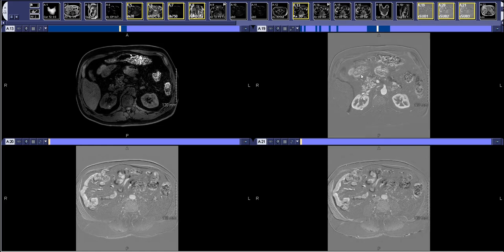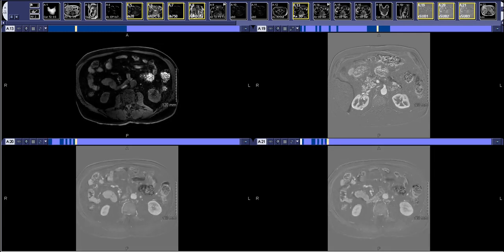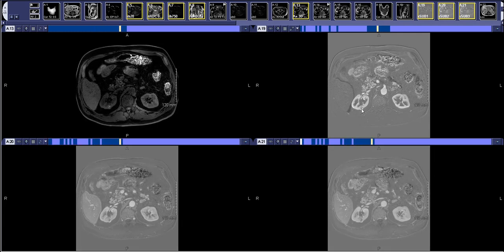In this case, there's little to no motion, and you can clearly see in the subtractions that this lesion enhances on all phases: arterial, venous, and delayed. And in this aspect, renal mass MRIs are very easy, because if you have a solid enhancing lesion, you cannot exclude a renal cell carcinoma. This could also be a benign enhancing solid lesion, but we can't differentiate on imaging. So essentially this needs to be surgically removed or ablated or closely watched, depending on patient factors. So in this case, we'll say finding suspicious for a small renal cell carcinoma in the mid-right kidney.